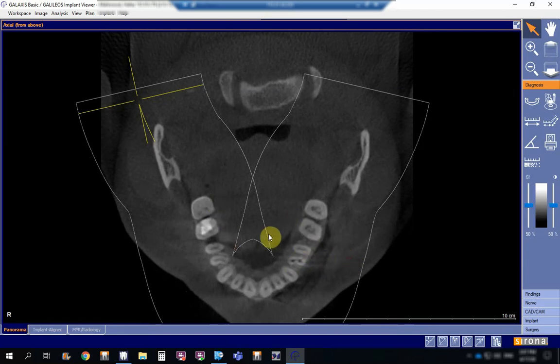See this shadow? This is the level of the tongue. It is not actually touching at the rugae area. So this is the level of the tongue. I'm still seeing the atlas vertebra, and you can see that the mandible still extends at this level, because you know that the mandibular condyle articulates above the maxillary, or above the maxilla.